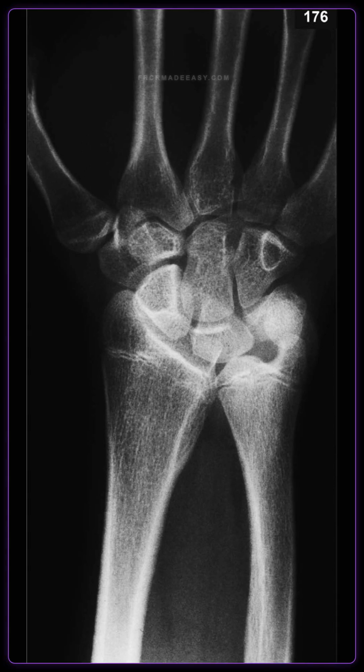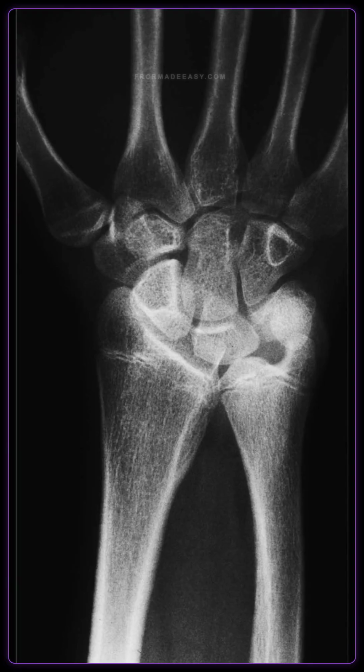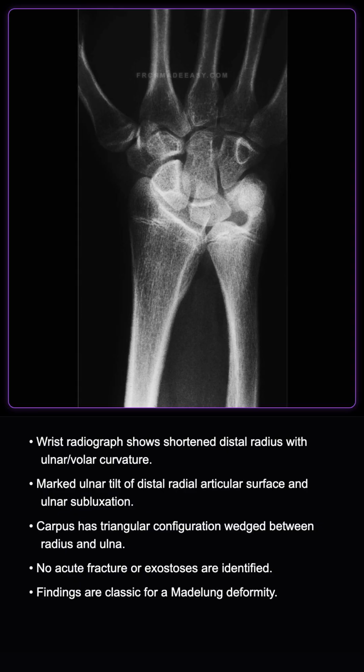A child presents following a fall onto an outstretched hand. I am showing you the radiograph of the wrist. Describe the findings. Let's see.